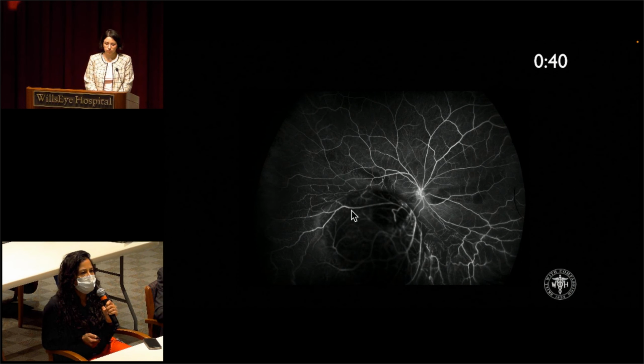And then looking at the vasculature overlying this mass, there's a lot of distortion, and I'm guessing that's just from the mass effect. It's hard to say whether this is true delayed filling or non-perfusion, or whether this is just distortion from the mass itself. We'll see how it looks in later frames, maybe some early microvascular leakage. But the other areas of the visualized periphery look relatively normal.